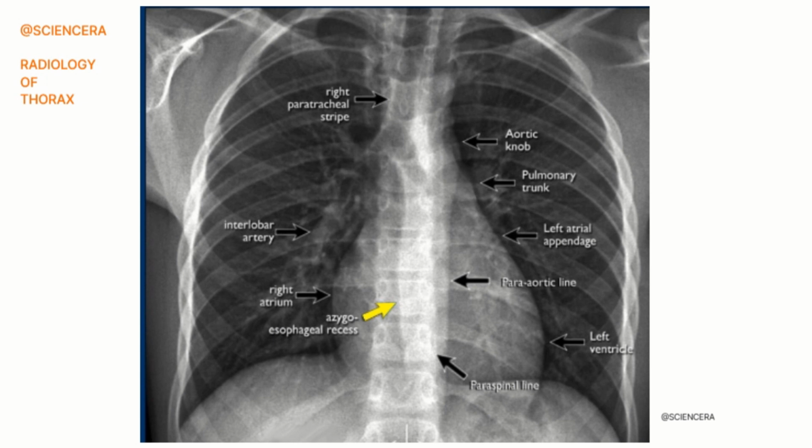When doctors examine a chest X-ray taken from the back, also known as your posterior anterior view, they pay close attention to certain areas where the lungs meet other structures like your diaphragm, heart, and the area in the middle of the chest, which is called your mediastinum.